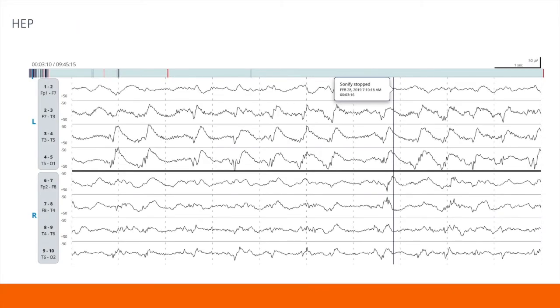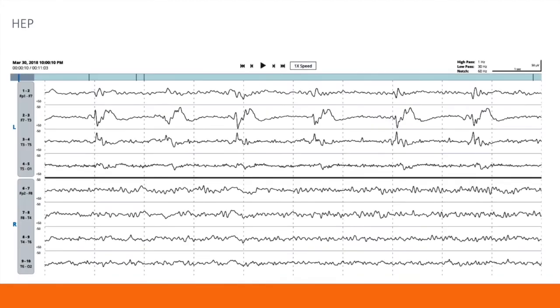Here we are seeing something different. We are seeing some sort of rhythmic activity that is on the left side more so than the right side. In this case, you are seeing some sort of a unilateral, more prevalent spike and wave discharges. If this is evolving, we call it seizure. This is a clear form of what we call lateralized periodic discharges, but again, the purpose of this course is not to explain the nomenclature to you, but to familiarize you with patterns that will definitely need your attention.